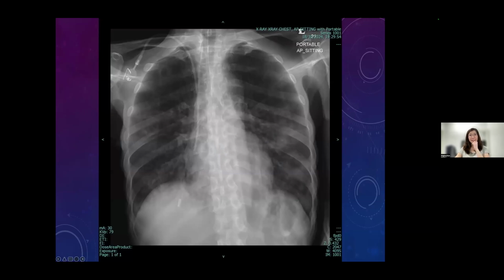Okay, what about this? I will expect an answer from the floor for this case. Cavitation, right lung. Okay, correct. Some more, lung mets, okay, some more. Are the bones, I think, a bit lytic. Bone stability, still okay. It's over penetrating. Okay. Anyone else? Come, make a guess. What is RT on the right? What does that mean? Betty, can you see it? Lokman, very good.